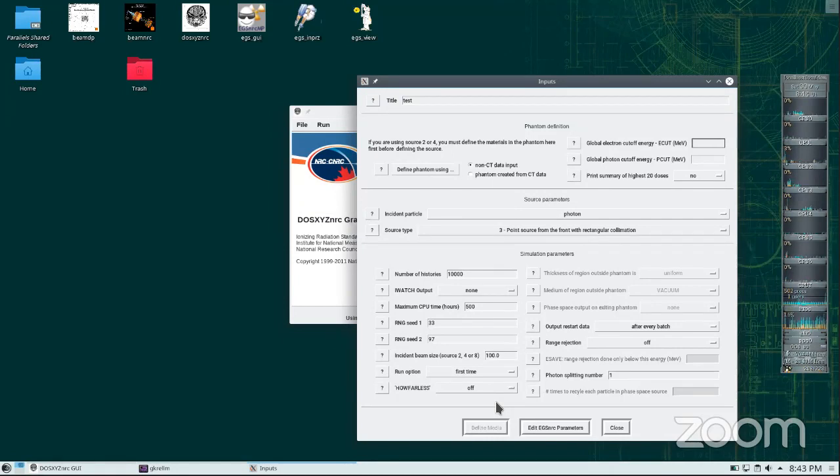So if your phantom is uniform, the same material, one way to reduce the calculation time is to stop telling the code to ask that question. Just transport it. So in this case, we want to turn this on. This is what's called how far less. But if you have different heterogeneities, you need to turn this off. Now there is something called thickness.